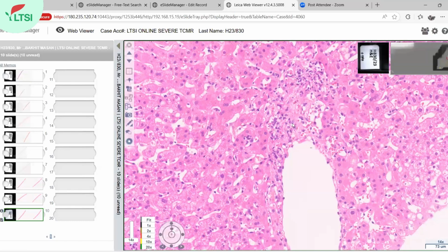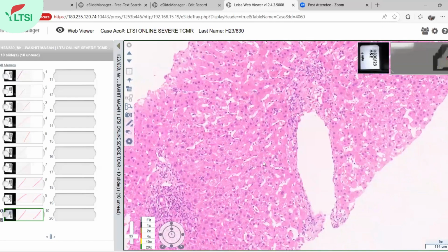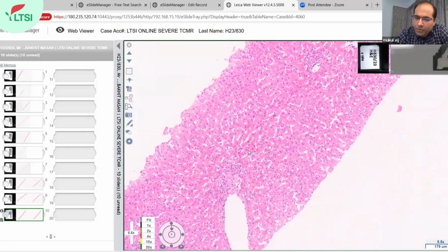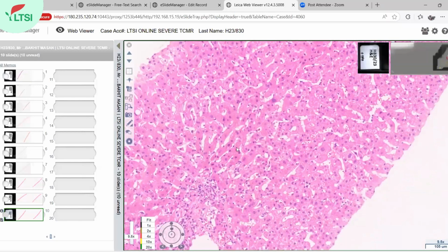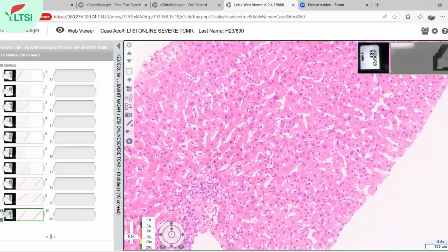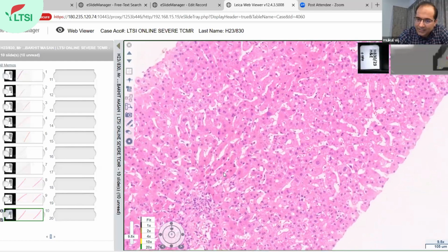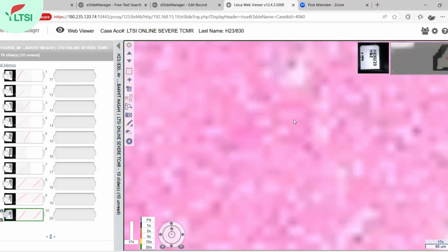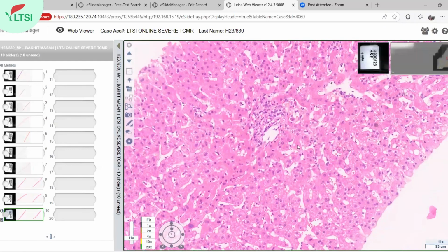Can we take the opportunity here to show them the lobular structure and how, like a cartwheel, it is going, and the cells are single cell thick? Yes. Possibly because there is an injury of the cell. So there is also central lobular infiltration. It's a beautiful demonstration of a cartwheel where it's all radiating out. Very nicely arranged. They are single cell thick, with single cell thick in between. Because later on you will see how when they get regeneration, they become thickened. So this is a nice demonstration of that.